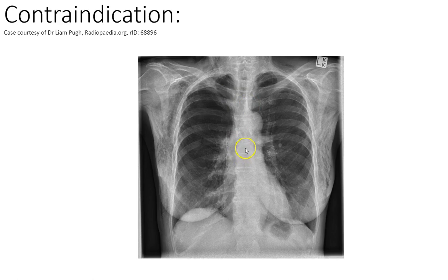I've seen this quite a few times in my career. Often it's associated with trauma or pneumothorax, so fractured ribs, pneumothorax, chest drain. And what this is, air has leaked out and it's in the tissues. So you can see the fibres of pec major as they come in across the chest.